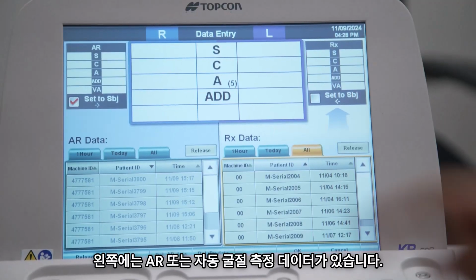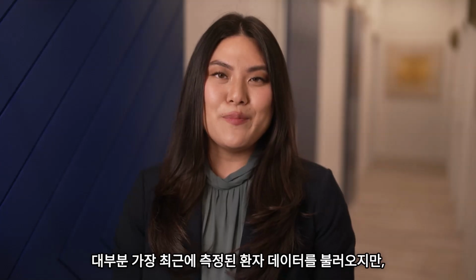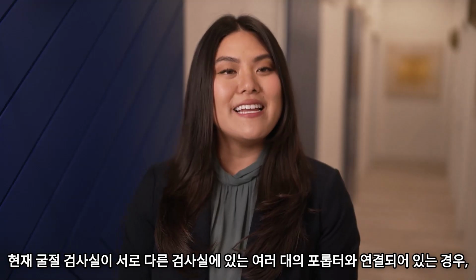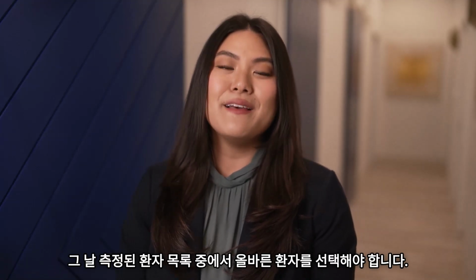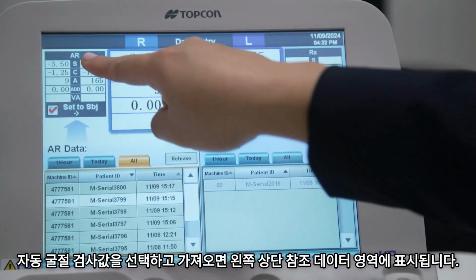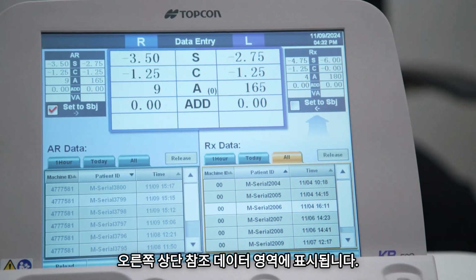On the left is the AR or autorefractor data. On the right, you will see the RX or computerized Lensmeter data. Often, you will be importing the most recently measured patient data, but if your pre-test room is connected to multiple phoropters in different exam rooms, you will need to select the correct patient from the list of patients measured that day. When you select and import the autorefractor data, it is displayed in the upper left reference data area. Selecting the correct Lensmeter data from the RX data list displays it in the upper right reference data area.